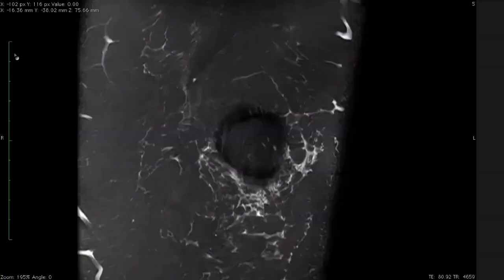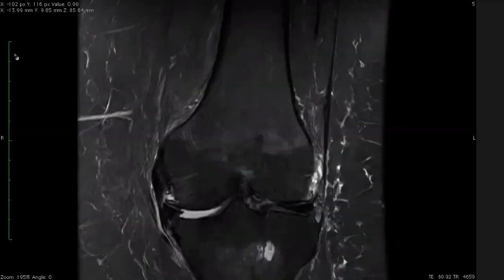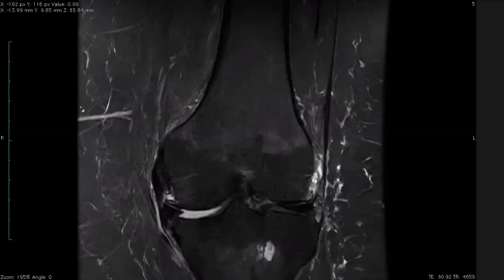I would say this is secondary. You can say secondary chondromatosis, or just say these are just kind of chondral bodies, basically. It doesn't matter. It's just an OA with multiple chondral bodies in the suprapatellar recess. All right. What about this one?